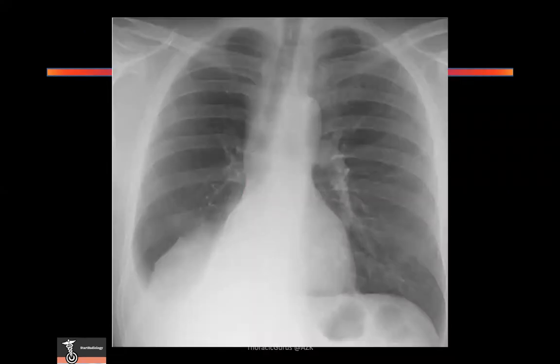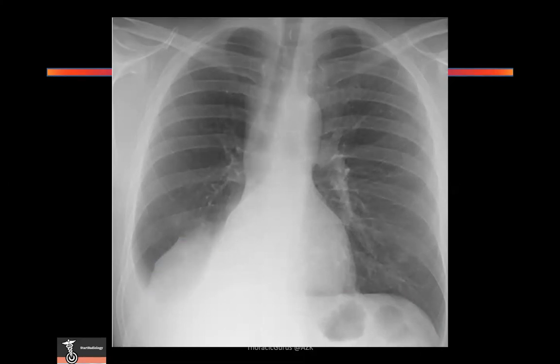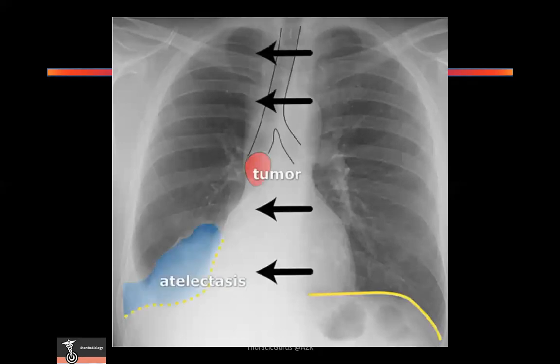All right. Okay. Look at this one. Have a look. Spend a few seconds on it. Pick up everything that you can. How many of you picked this up? Hands on heart, how many picked this up? See this.